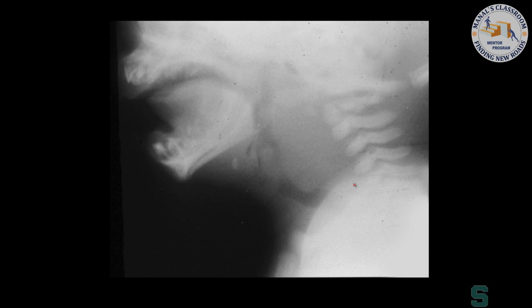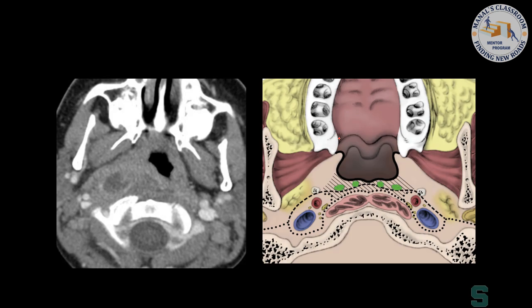And all of your partners are away at a meeting. So it's just you, right? So now what we see here in this plain film, we have all this increased soft tissue involving the prevertebral area. So now you're really stuck.